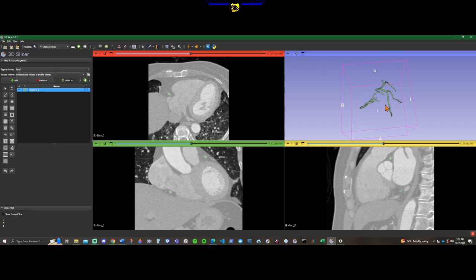So you'll notice that sometimes it'll show really far away, way down here or something, and all you have to do is click up here to center it and that'll change the view. Really quickly, you can control left click to rotate with this axis, regular left click just to rotate all around, middle mouse to drag, and then zoom in and out.